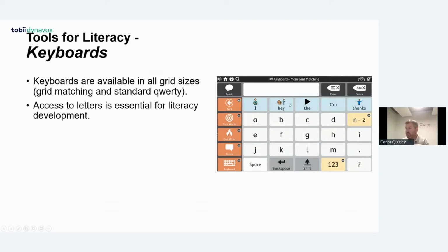It does have a symbol aid keyboard where it'll do the predictive word above and show the symbols, so people might have that recognition as well. So again, lots of different keyboards. You can edit them, you can change them, but it's up to yourself.